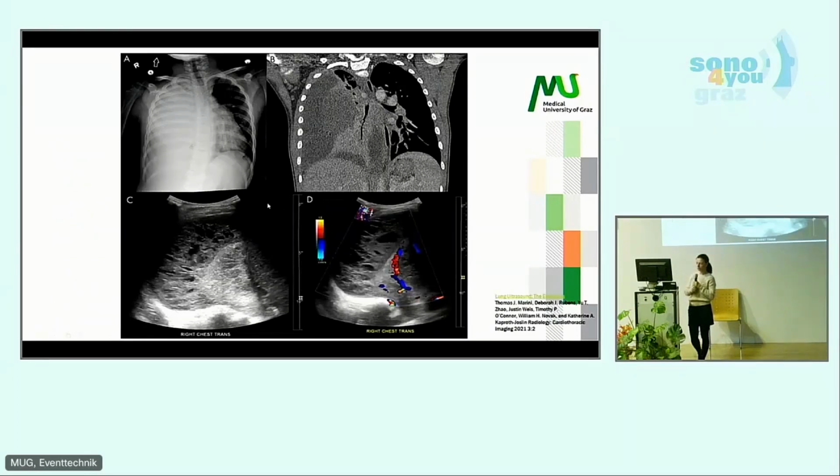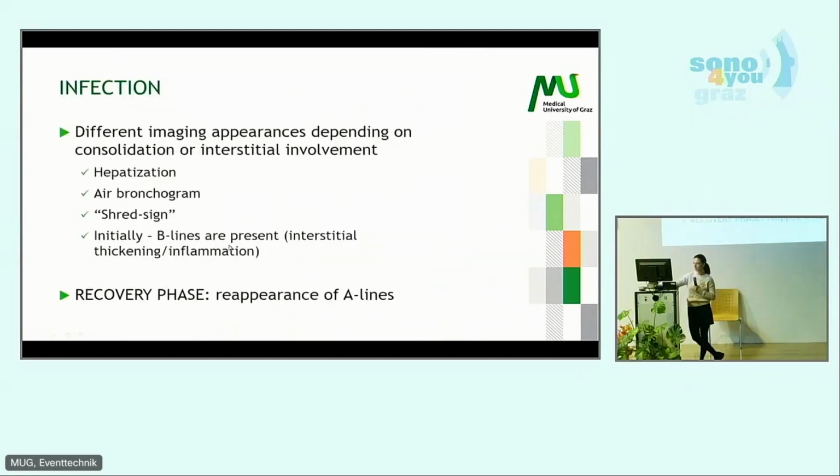This pleural effusion can make a little trouble for us. It can be complicated, like empyema. And we see a structure like this above the diaphragm, a solid structure with multiple fluid-like parts. Without Doppler, we don't know whether it's probably a neoplasm. It can be. So we are going to look into our Doppler images, and there is no vascularization inside. Sometimes when there are air bubbles inside of the empyema, we can see a twinkling artifact, but it is not so important now.